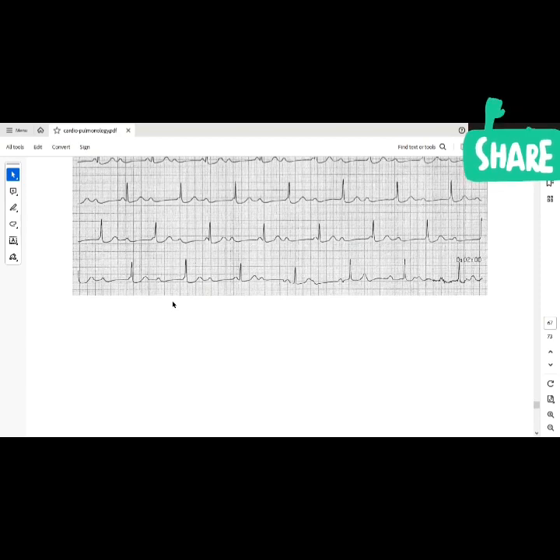The approach to tachyarrhythmias is going to be this. Of course, I will start with my rate to know that there's a tachyarrhythmia. So first step, rate, which means the rate is typically going to be greater than 100. When I see this, I have my differentials in my mind. But the second thing we usually do here is not P wave reading. The second thing we do is what? Check your QRS complex.